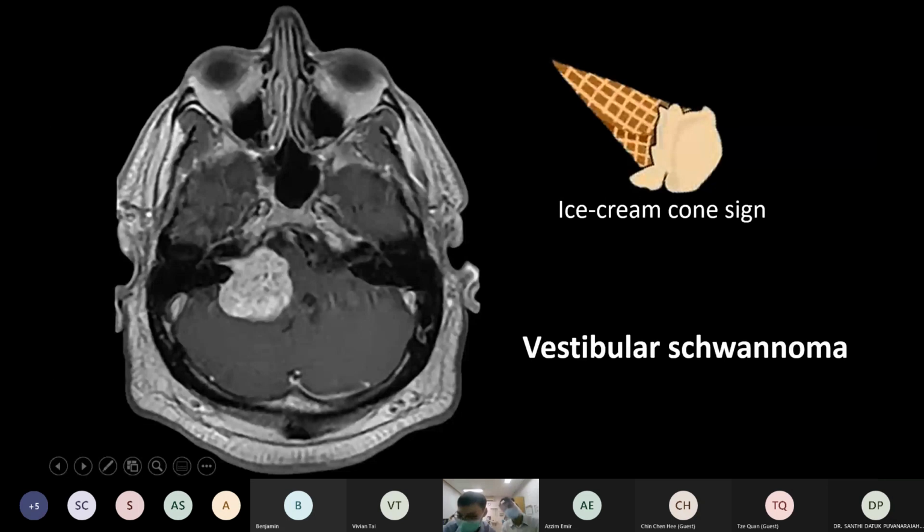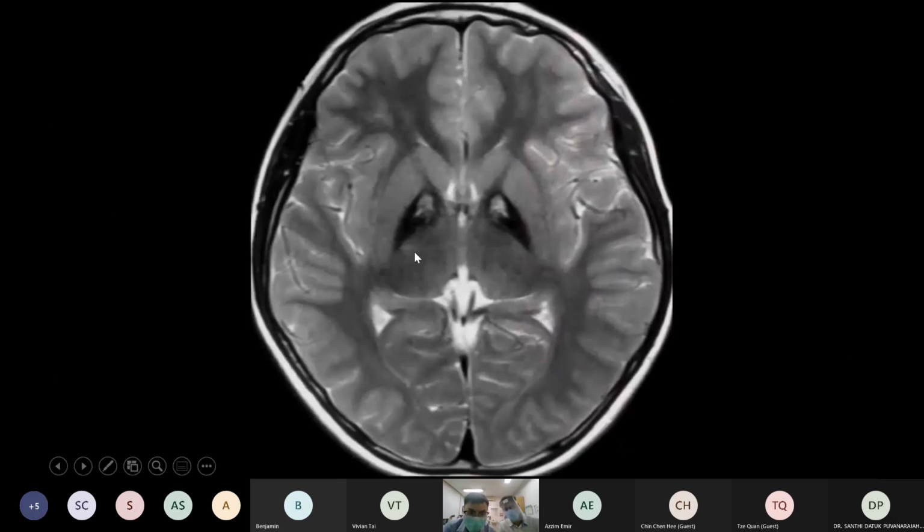And this one, just to save our time. Here we need to identify what sequence we are looking at. You can see gray matter appears gray and the white matter appears slightly darker, so you know that this is a T2. But you can see that there is CSF here, so the CSF was not attenuated. So this is just a T2 view. And in the T2 view, you can see that the globus pallidus appears dark, okay?